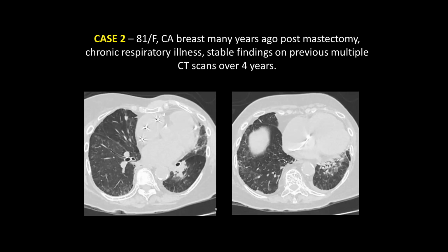They are not solid in the right lower lobe, and these findings have remained stable for the last 4 years. Actually, she had nodules like this throughout both lungs, both sides. So in this setting, stable ground glass nodules over 4 years, purely ground glass, no solid component, multiple, we have to consider the differentials, and she has a known primary.